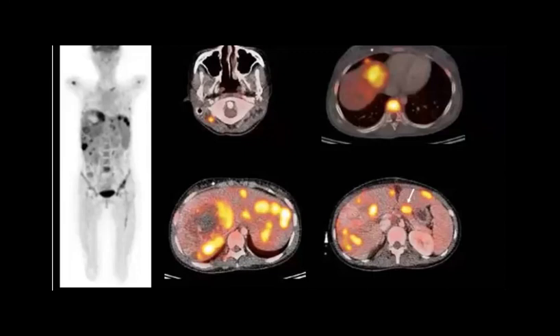So yeah, when you find multiple hepatic lesions with para-aortic lymph nodes, maybe a right posterior occipital lymph node, group 5, level 5. This one, okay. What else?